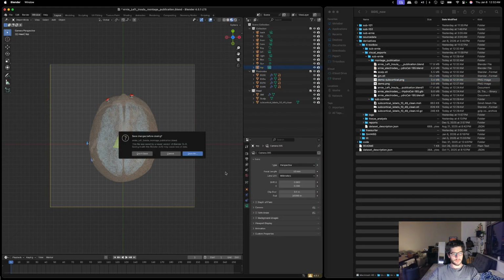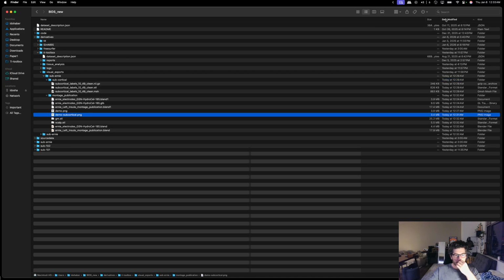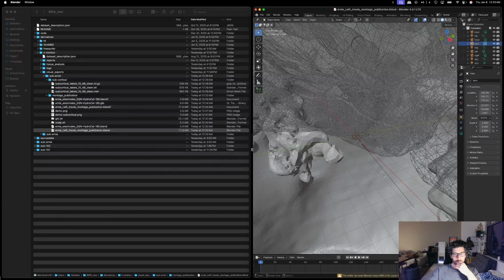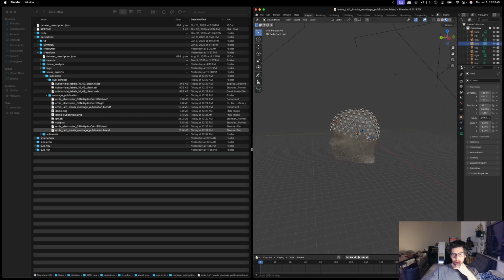So let's not save, and let's do this. That should be the one. Yes, and we have our entire net. We're able to do the same.